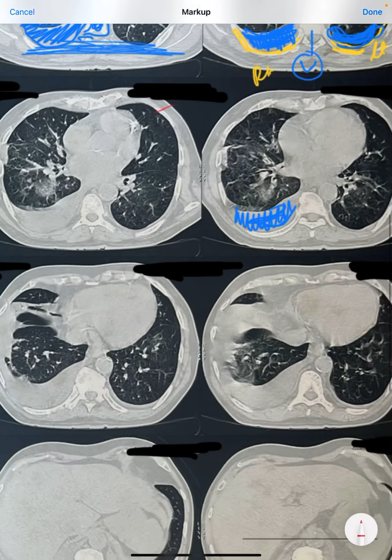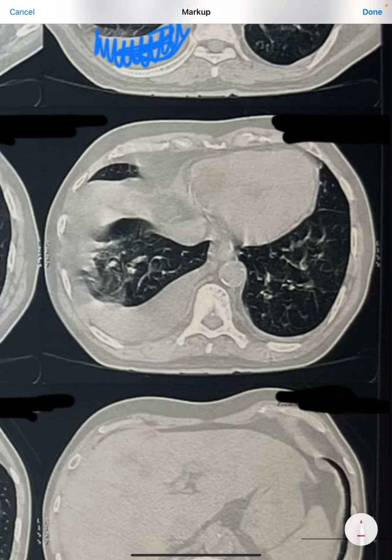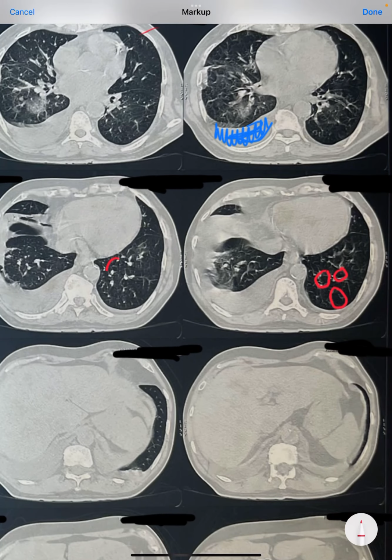So such patches, inhomogeneity, very commonly may suggest active lower respiratory tract infection. Apart from this, what we can see, there are so many small emphysematous changes. When we can see here, particularly this, what is emphysema? It is an abnormal, permanently damaged alveolar unit. So these small alveoli get damaged and they form a large lesion or large airway unit, which actually does not help in oxygenation.